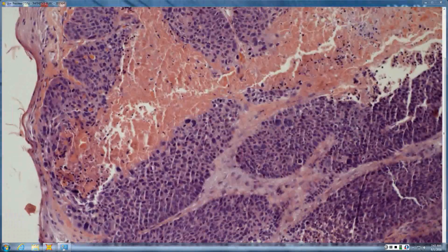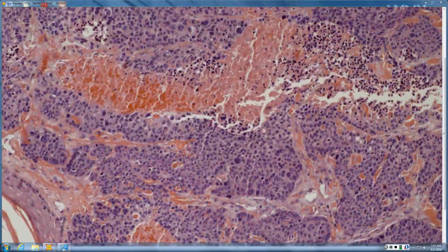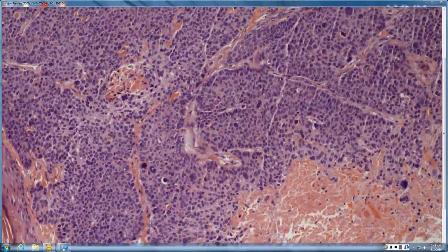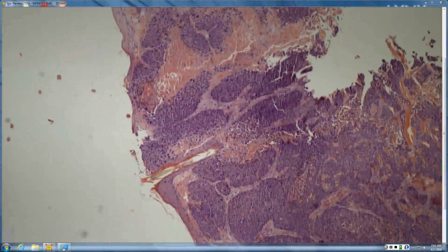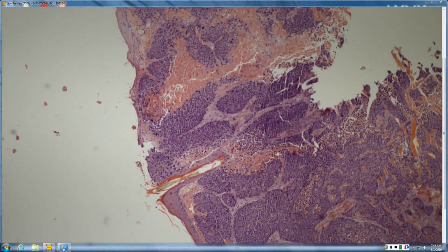So Merkel versus squame. Merkel certainly can be epidermotropic. It does look like it's keratinizing in some areas, very anaplastic. So two possibilities. One would be that it is Bowen's that's become invasive, because Bowen's starts as a much more anaplastic tumor that then can become invasive, or metastatic squame that's epidermotropic.